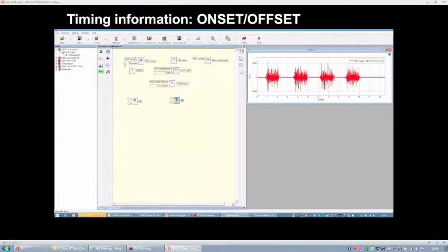Okay, so now I'm going to perform a high-pass filter first, in order to remove any movement artifact that can be present in the signal. It's typical to do that. And now I'm performing a low-pass filter set to 450 Hertz.